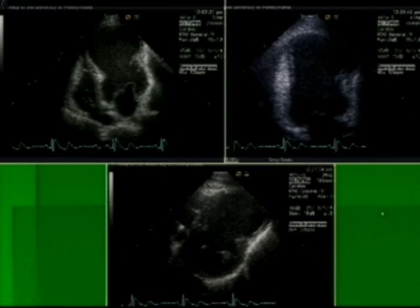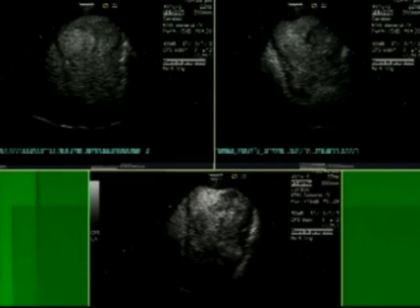Now, one of the things that we have a problem with is determining whether there could in fact be small thrombi within something like this. If this patient had had a gastrointestinal bleed or some other reason why it would be dangerous to anticoagulate the patient, although we'd like to, it would be important to know if there was in fact a thrombus and anticoagulation was absolutely necessary, and also give us more information about the characteristics of the thrombus. And this is where contrast comes in.